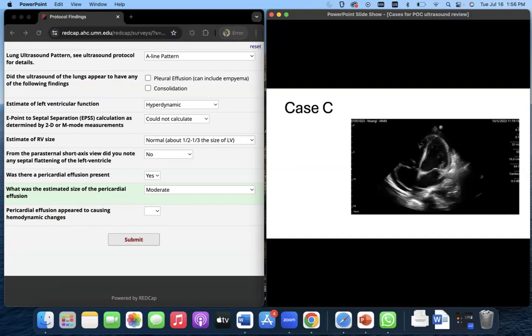Clinically, many patients would be considered for pericardiocentesis in these scenarios, which is of course limited in many places. Certainly before doing a pericardiocentesis in a patient with a completely collapsing IVC and a pericardial effusion starting to show some degree of collapse of the right ventricle, there is definitely a strong indication for giving more fluids.